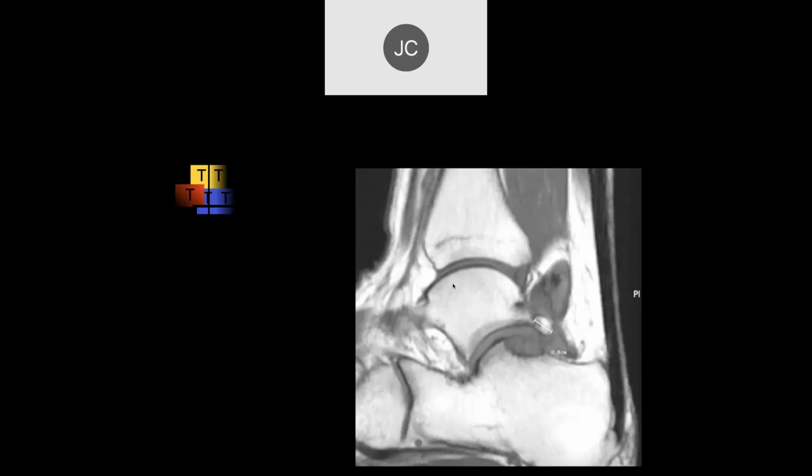Roberto. All right, so now we're looking at the ankle. Looks like there's some measurements on a stieda process there, and adjacent to that, looks like there's some hypointense soft tissue, some scalloping of that upper calcaneus area.